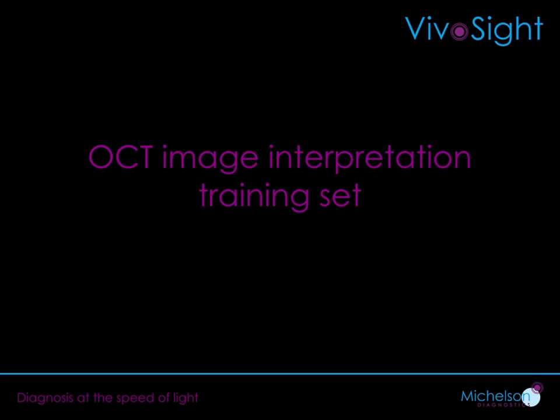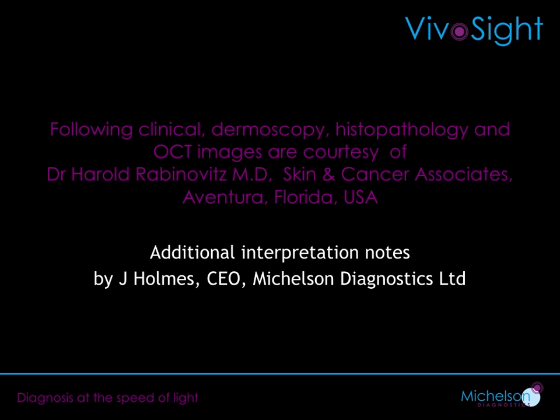Hello and welcome to an introductory presentation on how to interpret OCT images of the skin. Here we're going to take a look at some nodular BCC, some superficial and infiltrated BCC, AK and also squamous cell carcinoma. Finally, at the end, we'll also have a look at some other conditions that can be seen. It's not a comprehensive guide to image interpretation, but it should prove a really good way to get you going.